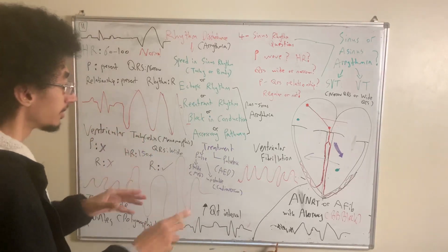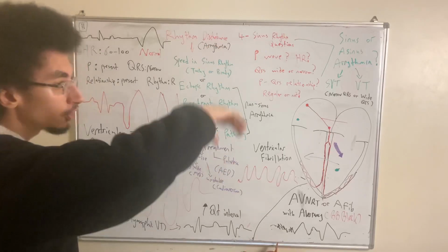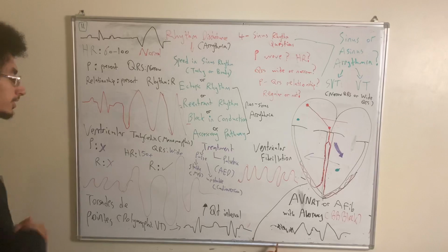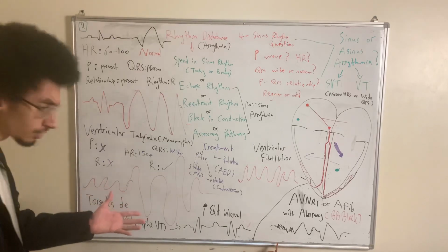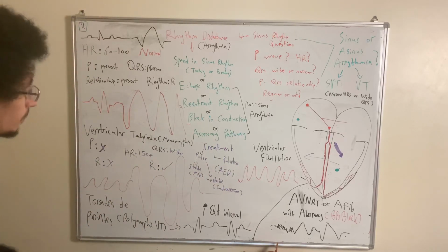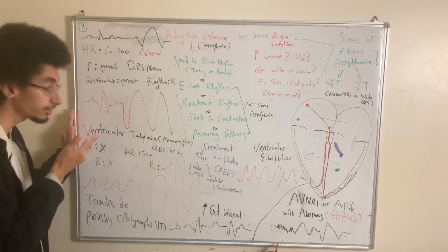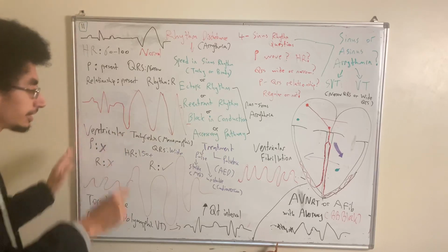First thing first, when you see a defibrillator machine, the machine will show you on its monitor, similar to an EKG, the rhythm tracing, and it will tell you, could this be ventricular tachycardia? Could this be Torsades de Pointes? Could this be ventricular fibrillation? Whatever. So it will show me the EKG tracing on the defibrillator machine. And if I see it, now I can decide. For example, in the case of wide complex tachycardia, if I see ventricular tachycardia, now I need to decide.